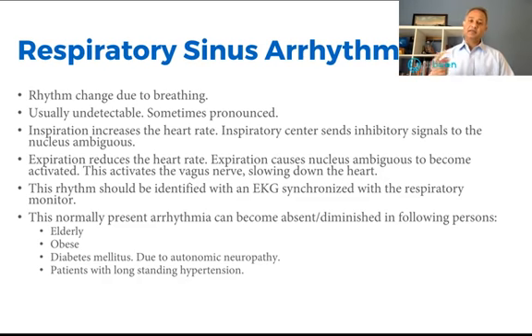And then the same thing on the opposite side, and the heart rate becomes slower. Now, in the EKG, if you're going to call something sinus arrhythmia, you better have some sort of respiratory synchronization with those wave patterns before you say, I have found respiratory sinus arrhythmia.